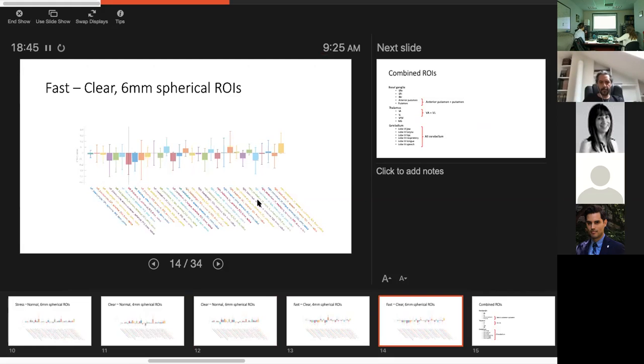You're trying to locate this area that across a bunch of studies seems to be more active during speech. So you want to localize it to some degree, but I think it would be good to do a sanity check and take a look at what these things look like.